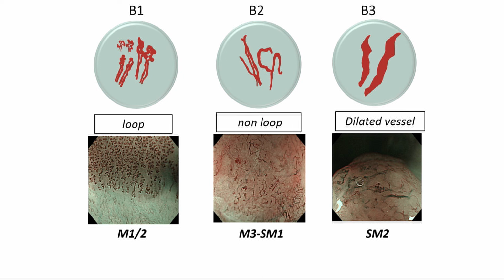So if you have a brownish area with this, so you have A1 which is normal or inflammation or low grade. So that patient you can watch or follow up or whatever. B1, go and resect. B2, send it to someone who can do a better ESD or be prepared for what it is. B3 is for CTRT, whatever.